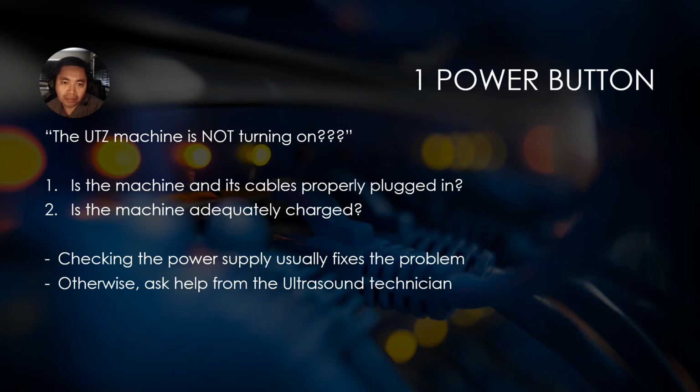Pressing the power button may sound very simple, but what do you do if the machine doesn't start up properly, doesn't turn on? Just like in any other electronic machine, you must check the power supply, check the cables. Are they properly plugged in? And for rechargeable machines, check if it's adequately charged. Addressing these issues usually fixes the problem. If you are unsure, just wait for an ultrasound technician to help you with the machine.